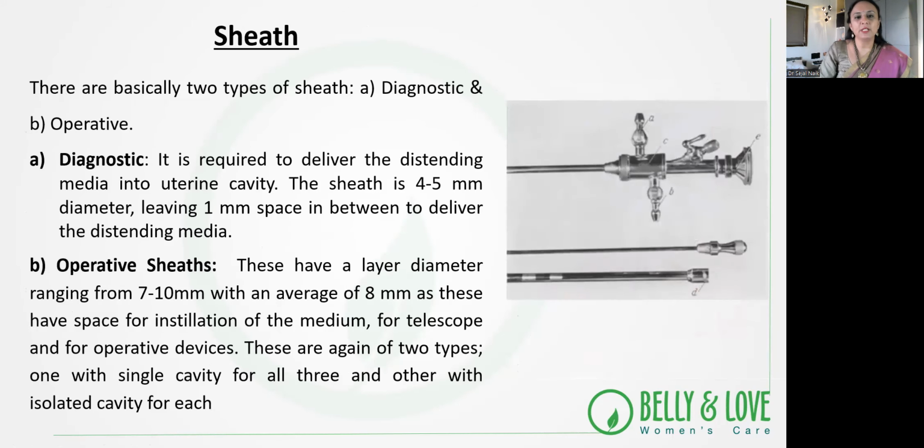Now, apart from the telescope, there are sheaths, which can be diagnostic or operative. Diagnostic sheaths have a 1 mm space between to deliver the distension media.